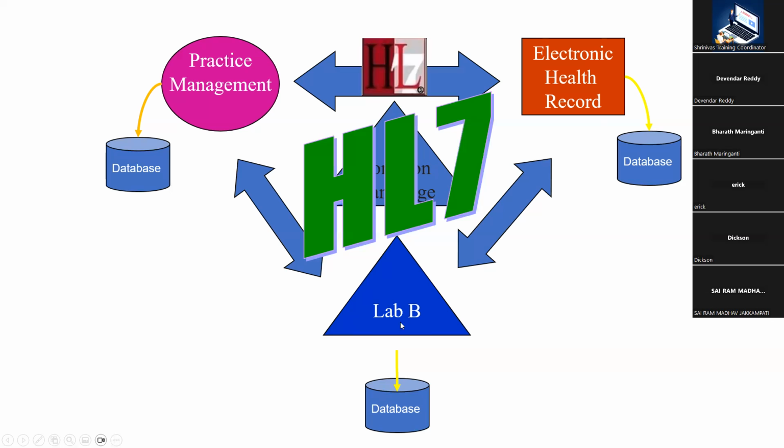What if there is a lab interface that is supposed to be implemented? They also need a demographic message. You can just replicate the existing interfaces and send it over to lab, which is very, very quick, right? Because here there is no dependency of analyzing the other database. All that you have to do is send the HL7 message. The lab entity will be able to interpret the HL7 message and write it to the database by themselves. Okay, so that's how HL7 has become the common medium of communication between many different healthcare application entities.